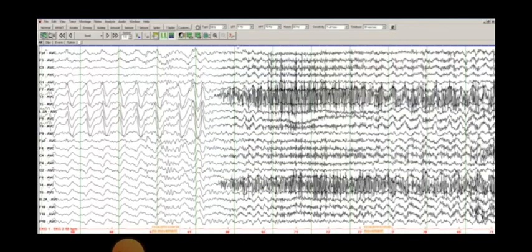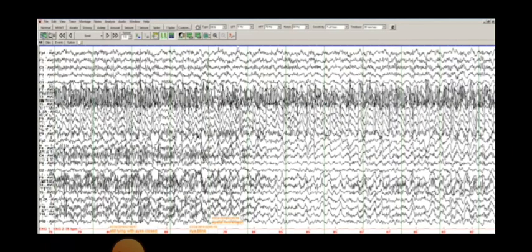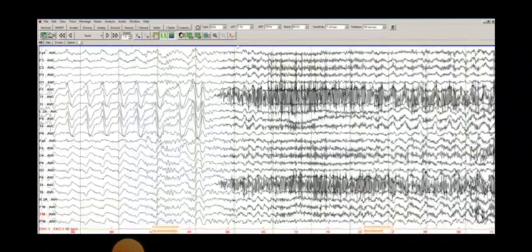Seizure that you are visualizing through muscle artifact. I'll move on to the next page, and you see the same thing here. The seizure is underlying this muscle activity, and I'll use some filters to clear it up in just a few seconds. And this seizure continues all the way down, and you see way more muscle activity. So the seizure, the clinical seizure, is also evolving, as is the electrographic seizure.